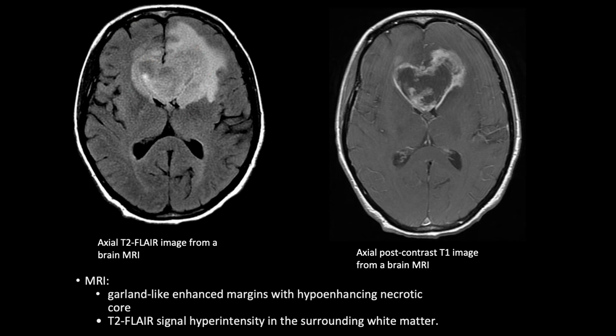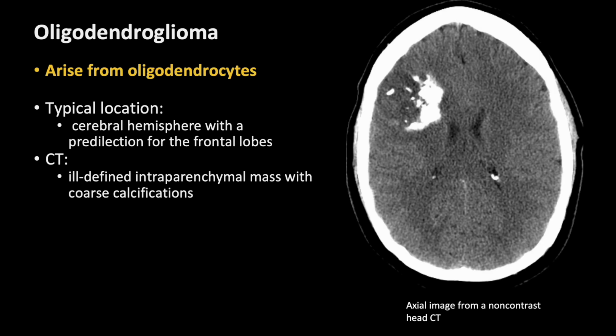In summary, a brain tumor that crosses the corpus callosum with its central necrotic core is very suspicious of a glioblastoma. Lymphoma is another tumor type that may cross the corpus callosum, but it is rarely necrotic prior to treatment.